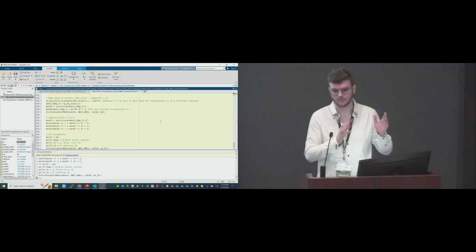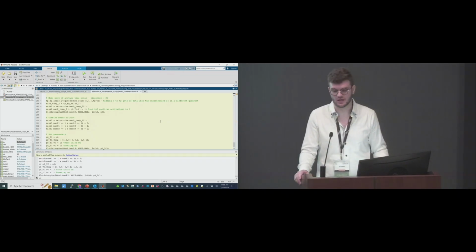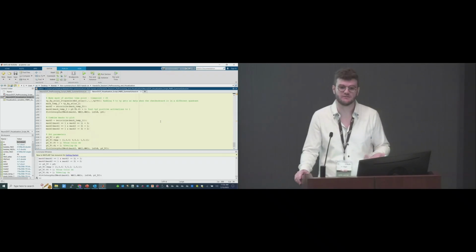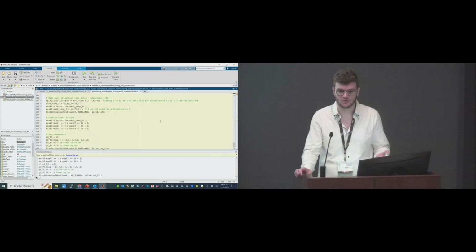We also have loaders and savers for volumetric data if you want to save your data in volume form to NIfTI files. On top of that, the only other conversion function we do have is from Lumo data to NeuroDOT. But if you have your own data type, feel free to send myself or Emma an email at the NeuroDOT support, and we can look into that and build a converter for your data type.